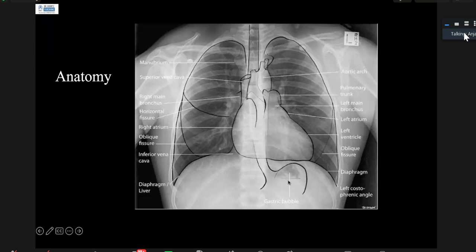Have you ever wondered why the mediastinum and the diaphragm are getting a border? That is because of the contrast between the soft tissue density and the black air next to it. In other words, if air comes to lie next to a structure, then the outline of that structure will be seen clearly on the X-ray.